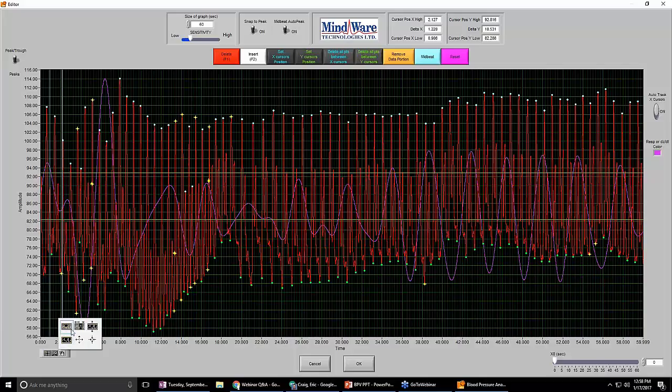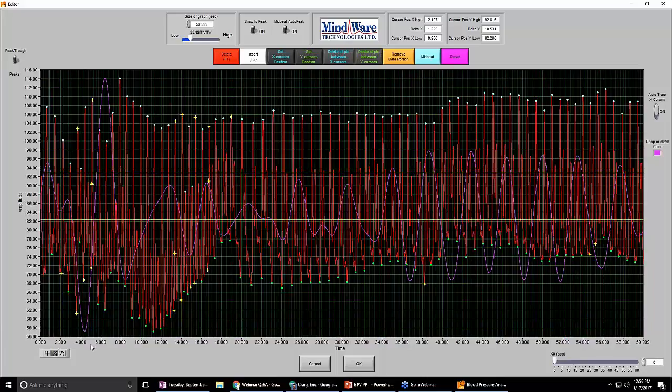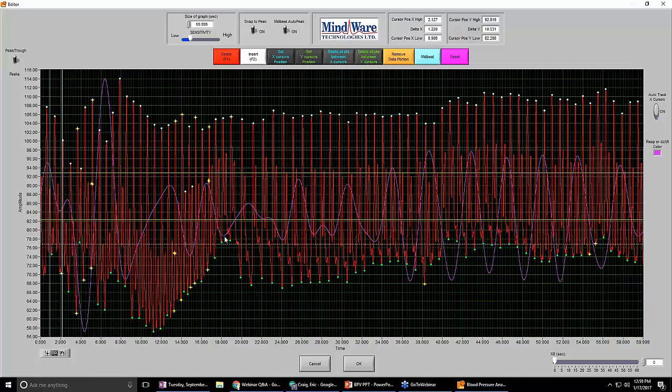We'll jump through these real quick. This one right here is basically a window, so you give it the actual area that you would like, and it'll jump to that. This one right below it will zoom back out to show you the entirety of all the data. So if you zoomed in and want to get back out, that's how you do that. This one right here is what I like to use the most, and that's going to preserve the amplitude of the waveform, as we can see all of it, but it's going to let us zoom in on the x-axis from there.